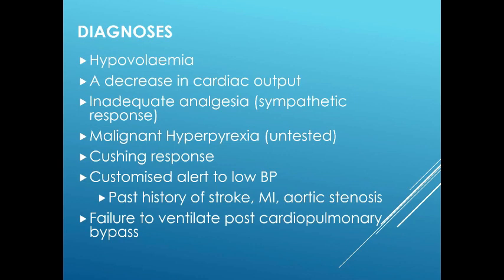The hypovolemia alert can be activated at the onset of an epidural or spinal block. Blood pressure may fall, heart rate may rise at the onset of surgery, and the pulse oximeter positioned on a finger may indicate vasoconstriction, as it is not affected by the block.